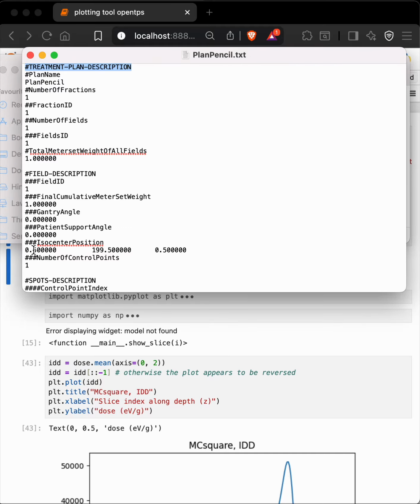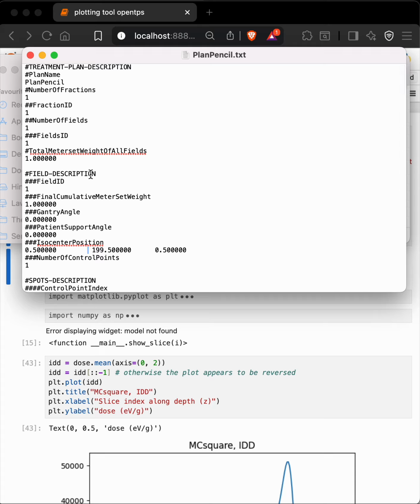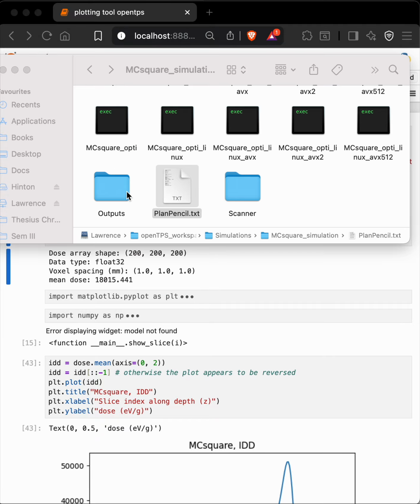I think this is the Z direction. I'm not sure though. This is Y and this is X, because I'll show you how if I change those, but I'll not confuse you. So this is how you get the output, like where your beam is, how it is kept and stuff. So you can check that.